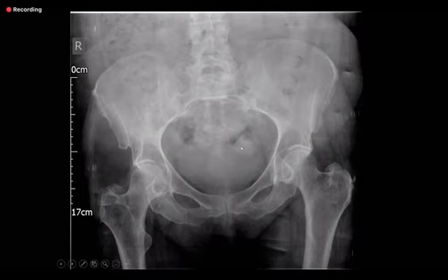I noticed some density there. There could be a calcified fibroid. There is a swelling on the right side, clinically speaking. On the right side. Yeah. I was looking at this area, where there's an increased density going from the iliac ASIS down to the greater trochanter here, which is not visualized here, but it could be just cut off.